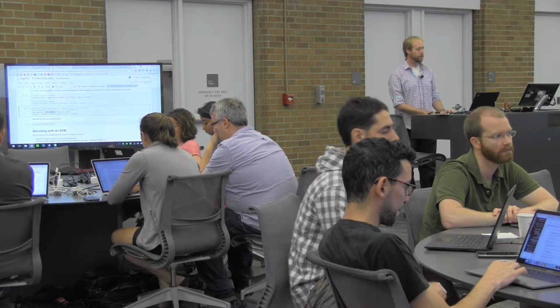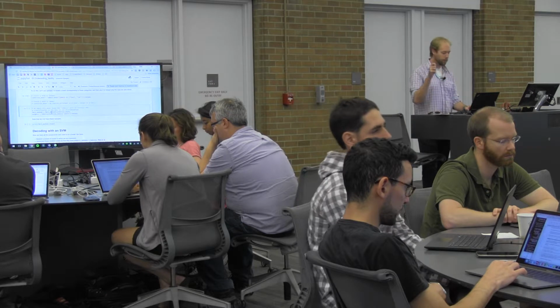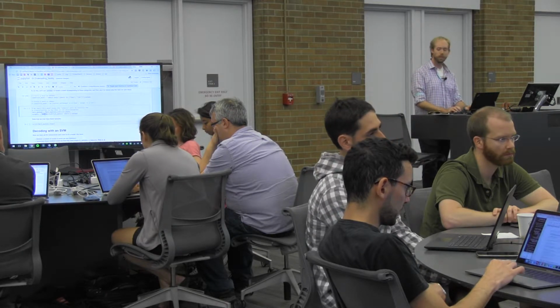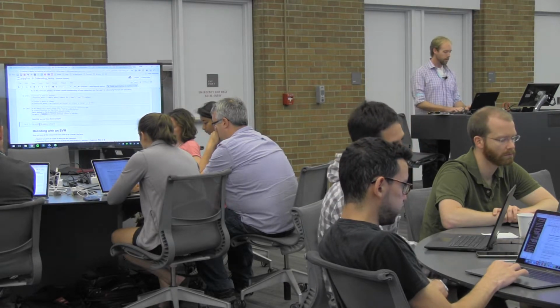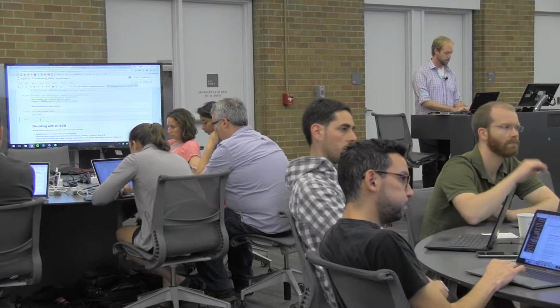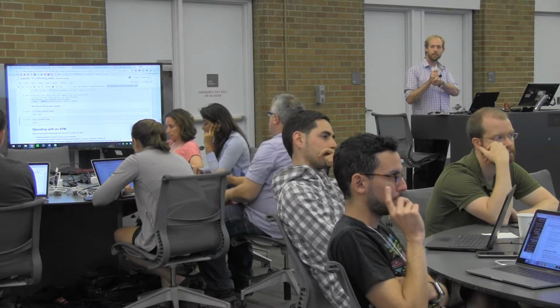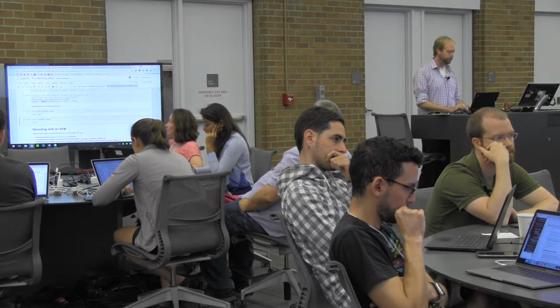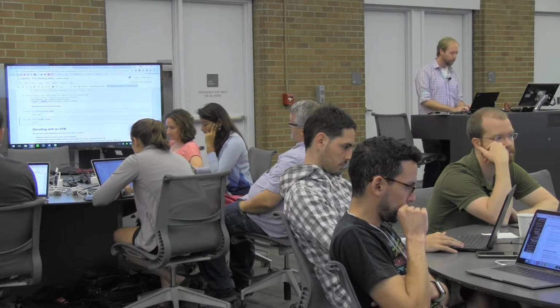So what I'll do is index into our masked fMRI data. This is of shape samples by features, as well as into our labels data here. This is just of shape samples, a one-dimensional array. And now I have two objects. One of them is samples by features corresponding to voxels, and another object corresponding to just samples, and that is the category of each trial. This is the X and the Y matrix that we will use in our machine learning model.